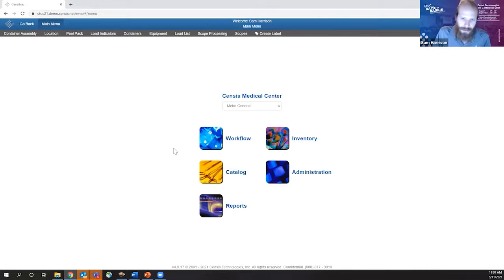So we've created all this stuff, and next we're going to go through the user-end functionality of processing a scope. You're going to see what that looks like in a non-CensiTrac Advanced setting, so you'll see what the technician does step by step. Then I'll go through the CensiTrac Advanced portion and show you what the difference is. That won't take long, because we don't need to do anything with the configuration of devices and device groups. It's just with the scopes themselves. So we'll do those 2 things.